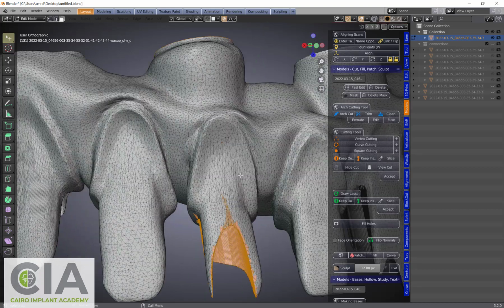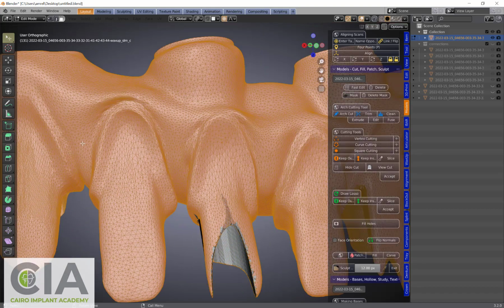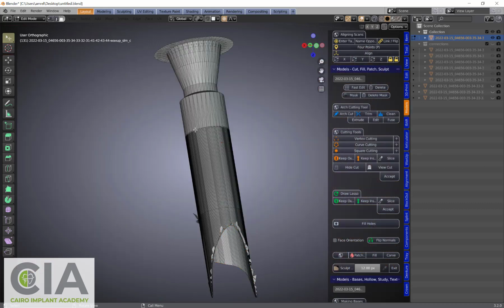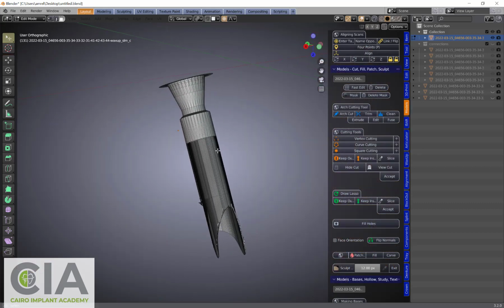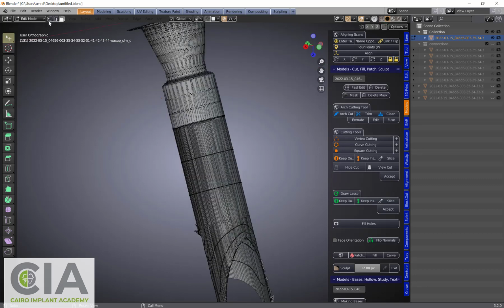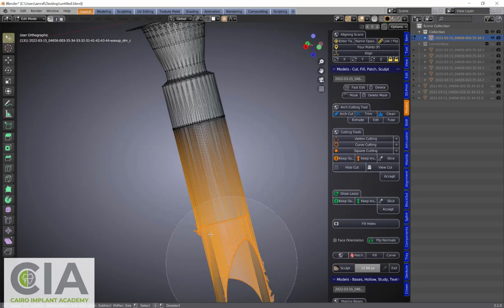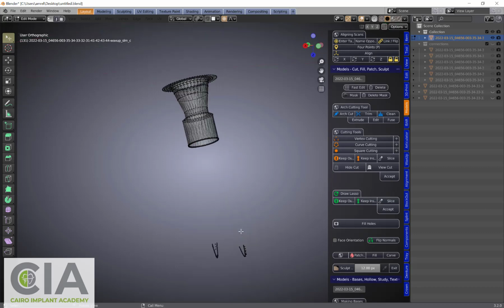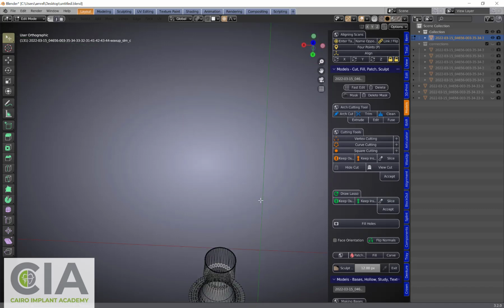Then I'm going to invert the selection, and then delete faces. Now I have this part. Probably I would go a little bit more. I don't need this, so I'll just select this to be out of my equation and press X, vertices, and this is actually my connection.